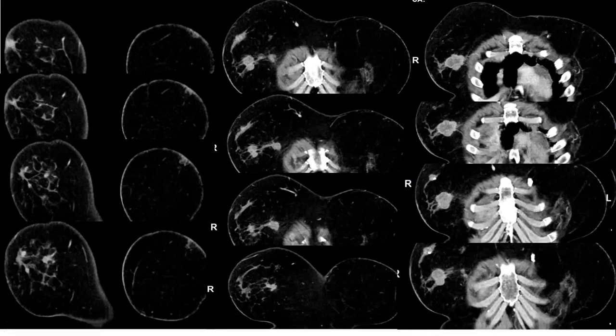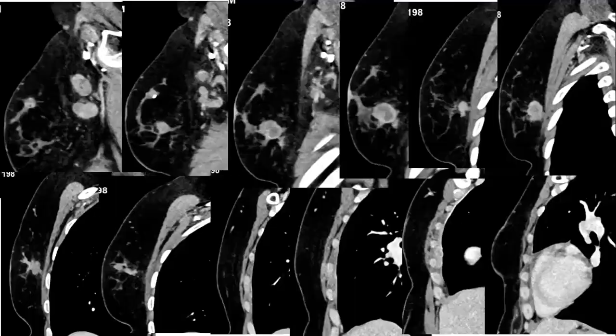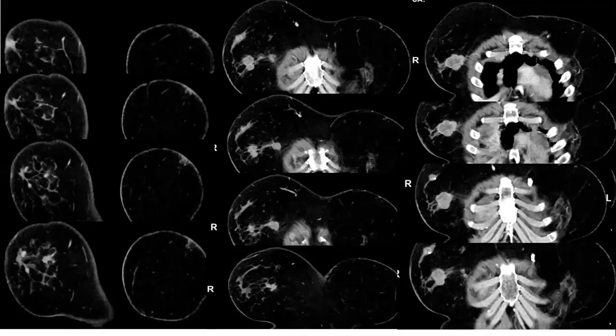There are interconnections between all of the lesions, as if even multifocal, as if it is the same ductal system, even for the lesions far away in the upper superior breast. And here, if you look for the peripectoral edema, and if you come here, look for the lesions, it is almost abutting the pectoralis. And look here, the edema is enhancing, and the pectoralis itself is focally thickened and enhancing.